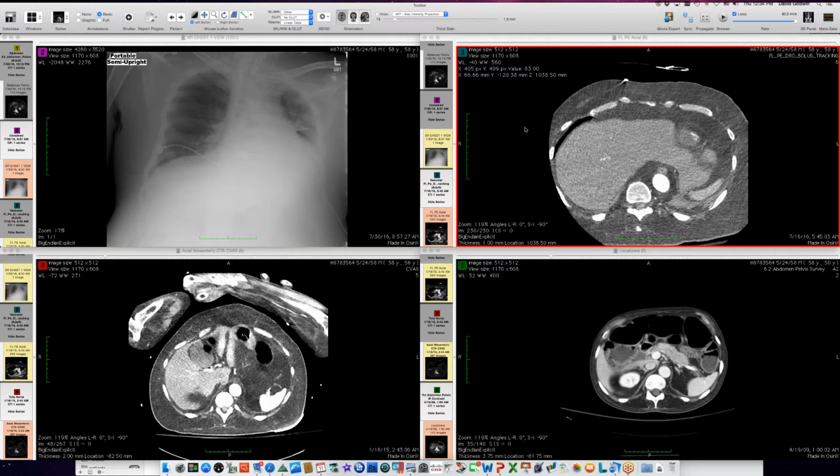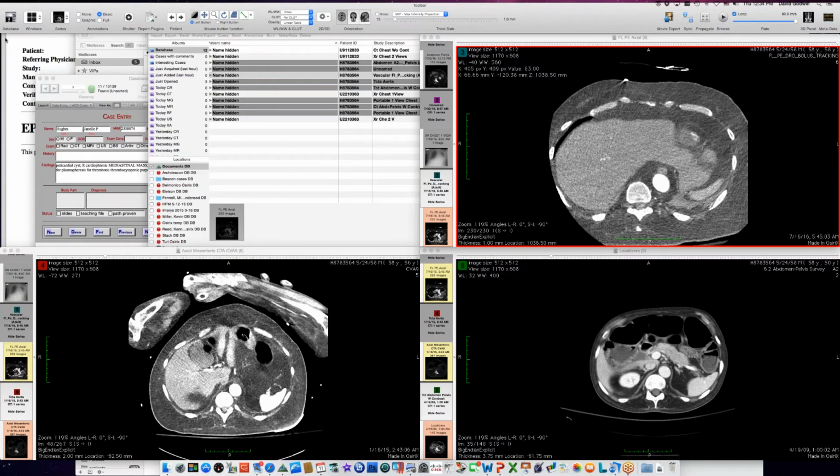So here's a man who has polymyositis and has respiratory insufficiency. You can see that he has a tracheostomy tube here because he really can't ventilate very well. And his lung volume is much lower than it was if we go back, say, to 2008. I wanted to show you his CT scans over the years.